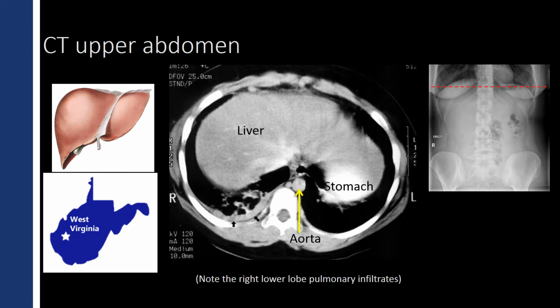Now, the aorta comes down, as it has throughout the descending portion of the aorta in the thoracic region, on the left side of the spine. So the aorta is very close to the spine, but to the left of midline.